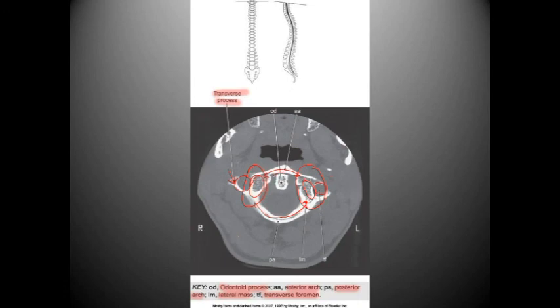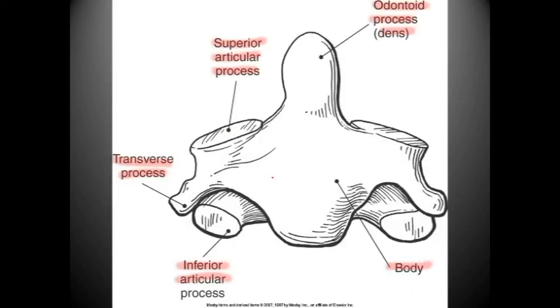Also, we do have the odontoid process sitting inside, and if you'll notice, it might be a little hard to see on your screen, but we have what looks to be a darker or hypodense circle here, situated on the inside, and that is where the spinal cord is coming up and getting ready to enter into the skull. I believe that is it for that image.